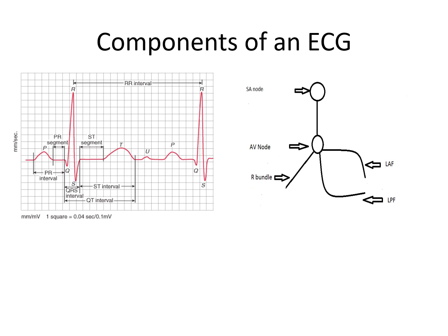On the ECG, on the x-axis is time, so the wider something is, the longer it takes. Because the His-Purkinje system is functioning and is fast, it results in a narrow, tall spike. After that, the system resets itself. This is represented by the ST segment and the T wave.